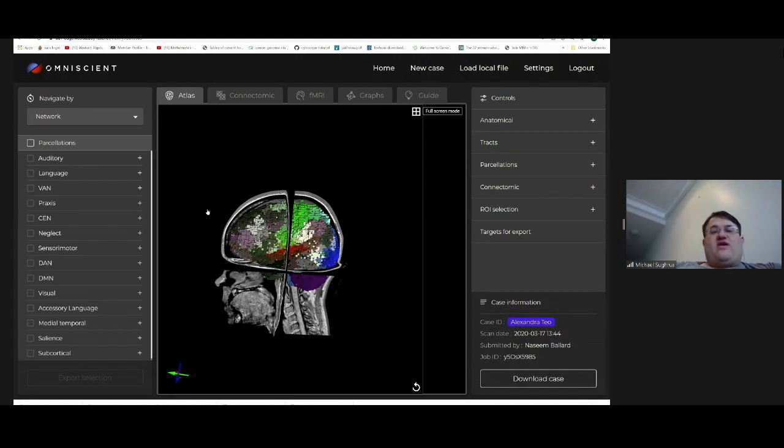As you can see on the left and right side are navigation panes. The right side involves mainly controlling what's in the rendering and how it's viewed. And the left side involves subsetting. And we'll talk a lot about how to subset different combinations. Also, as you can see, there's a variety of different tools here on the top. These two will be coming relatively shortly. This is a mainly DTI-based module that works with a machine learning-based atlas that we'll describe in more detail later, but I'll demonstrate its basic character in this demo. This is a series of resting state correlations. And then also in a connectivity matrix, I'll be demonstrating that. And here at the guide, this links to a series of a lot of the anatomical and literature-based descriptions on what these areas do, or at least what we know about what they do.